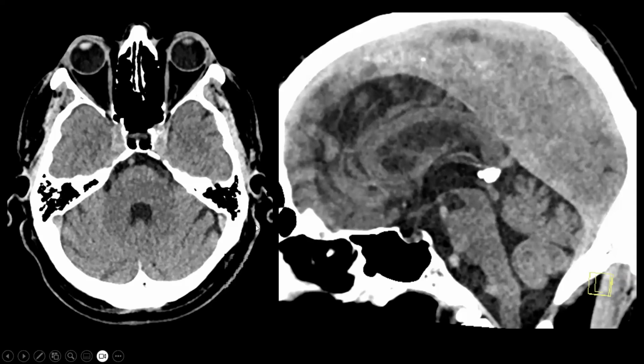The last ventricle we need to discuss is the fourth ventricle, located infratentorially. We can clearly see it here on the axial image between the brainstem and the cerebellum, and also on this sagittal image. Once again, we have a very narrow passageway connecting the third ventricle, located over here, and the fourth ventricle. And this is the cerebral aqueduct.